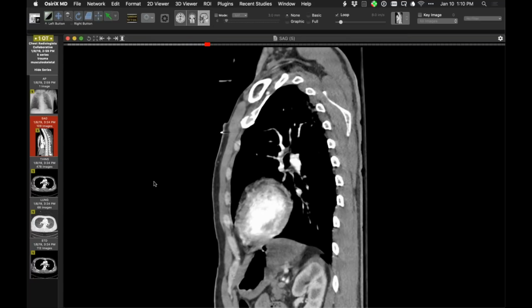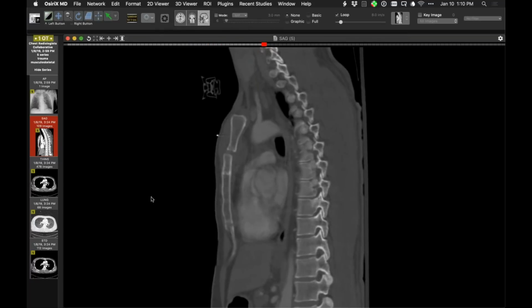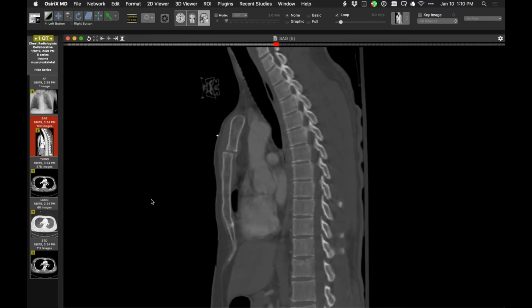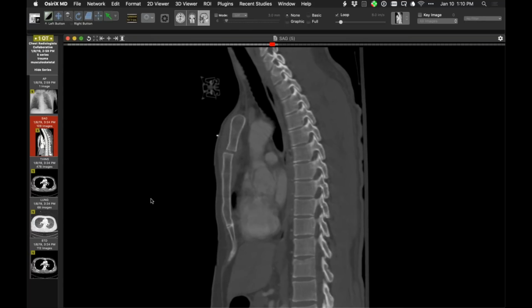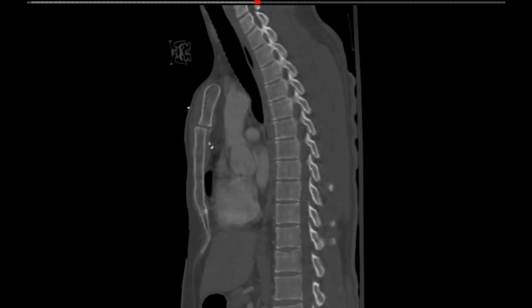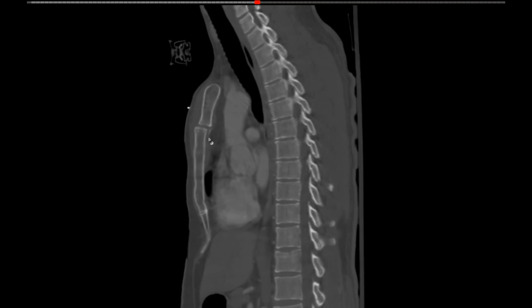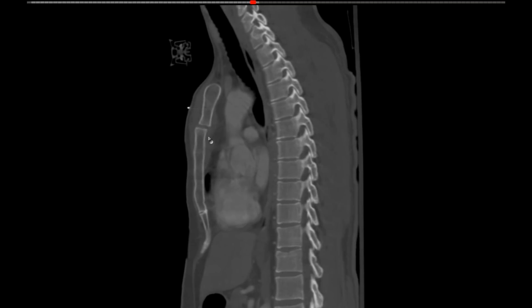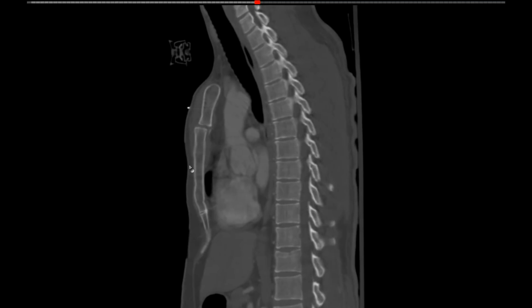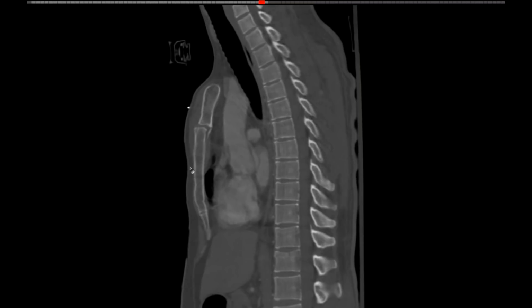So here he has a fracture, but you'll see that his manubrium is displaced slightly posterior to body of sternum. So there's the fracture there. There's a little hematoma in the mediastinum, but this is another partial dissociation between manubrium and body of sternum. And just by chance, I came across this case the other day too. So an interesting injury again, right there.